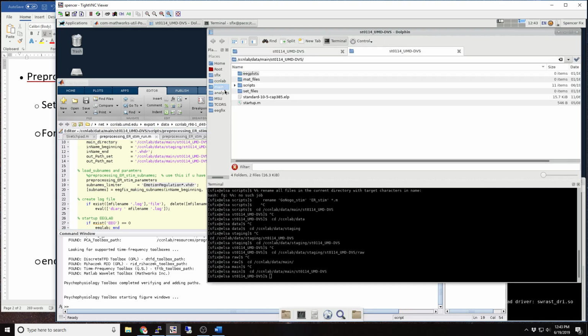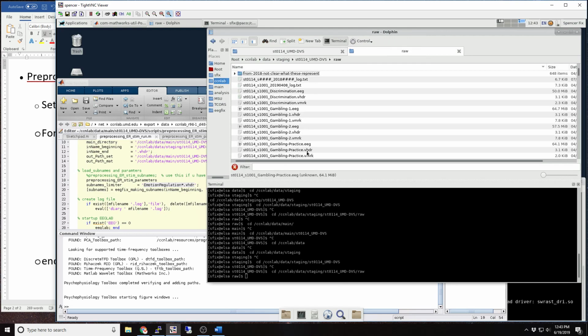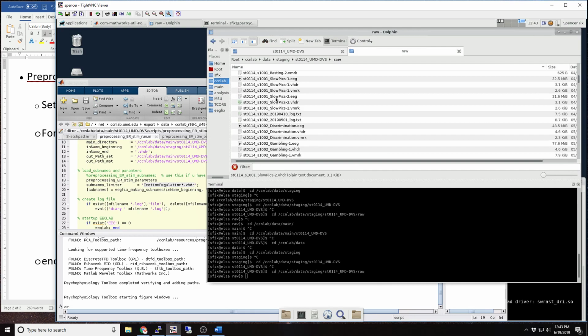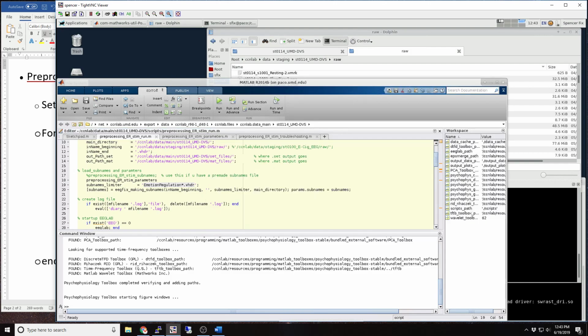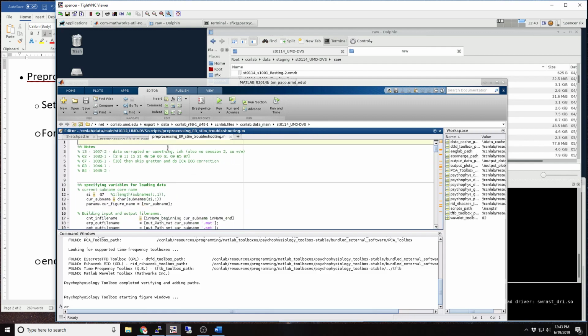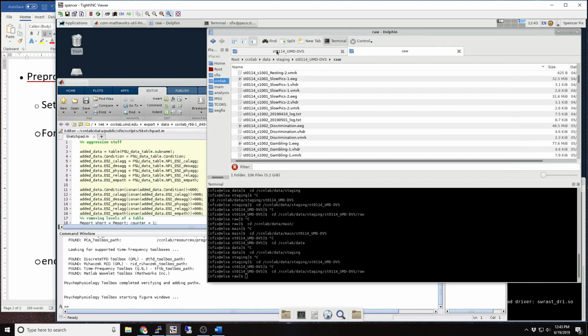So let me actually go back there and make sure, take a look at how things, oh, it's not emotion regulation, it's slow picks. Okay, well, I need to change that. So this has already been saved. I'm just going to close these and re-grep everything.